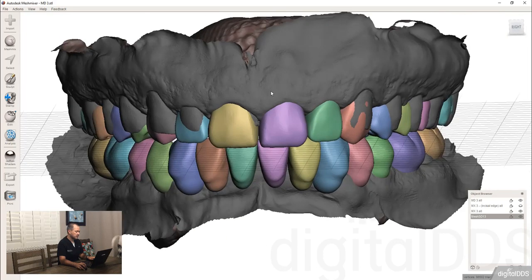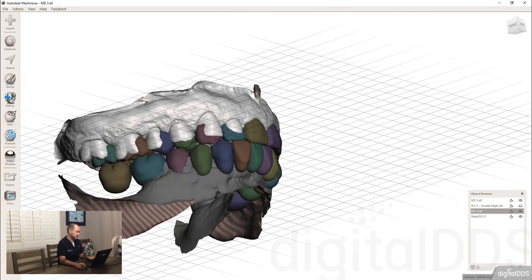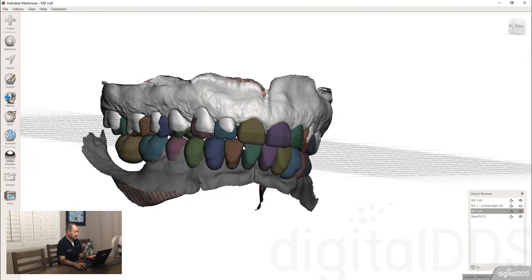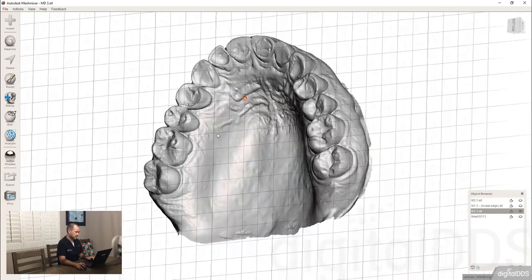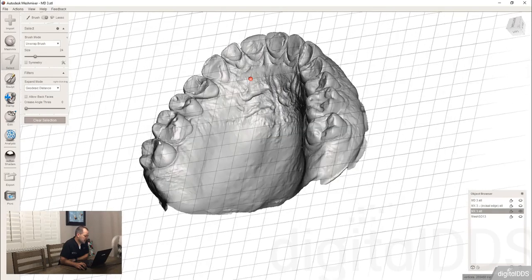So for some reason, these ones, I know I said I wasn't going to do this, but if you were to mess around with this, what I would probably recommend doing is kind of hide this, get out the one that you're going to mess around with, and I would probably go under select and use the lasso and just draw right around.